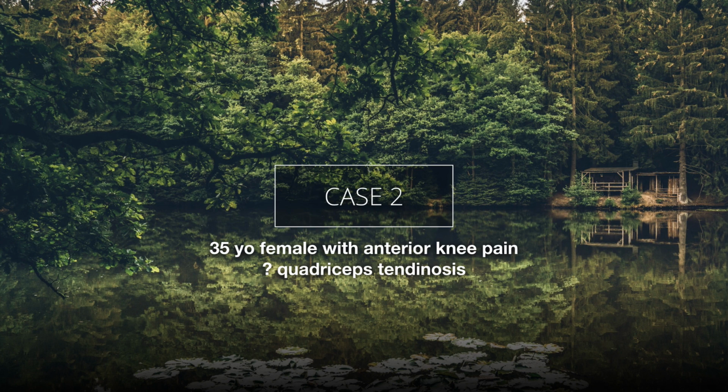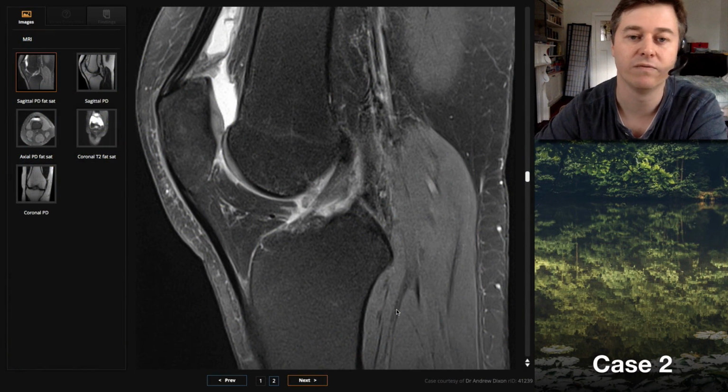All right, case number 2. A 35-year-old female with anterior knee pain, quadriceps tendinosis. So someone's going to have a look at this one for me. Yeah, I'll have a look.